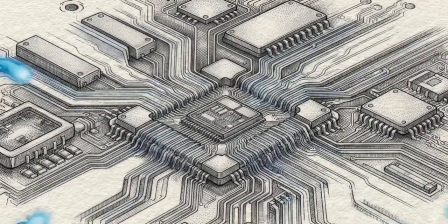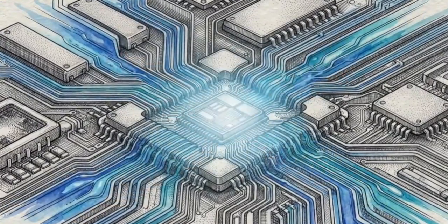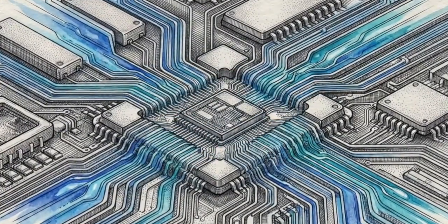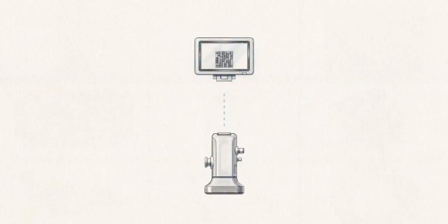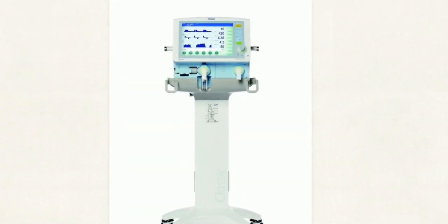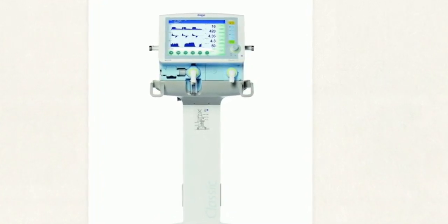Processing all of these physical inputs in mere milliseconds requires immense computational speed, running quietly behind the display. Ultimately, the command interface is where clinical strategy takes form as precise machine instruction. That instruction immediately travels downward from the screen into the physical hardware. This midsection chassis is the pneumatic block. This is where digital algorithms are converted into pressurized airflow.